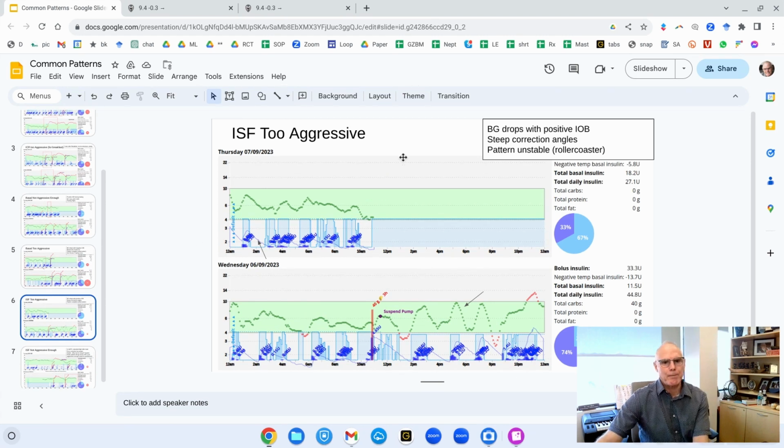More controversy. The endocrinologist, the diabetologist looks at this screen, what do we see? We see 3 lows the day before, one of them in the wee hours. So we need to give less insulin. We're giving too much insulin. Does it look like a mealtime problem? No, because certainly not here. And here we see a roller coaster.